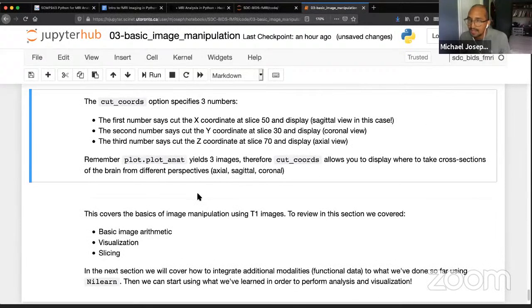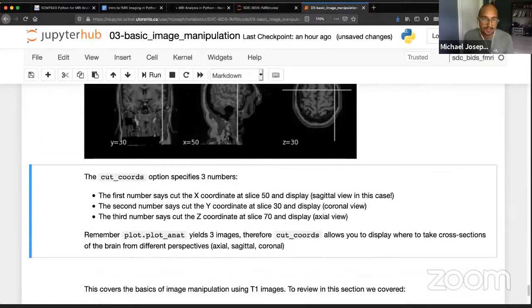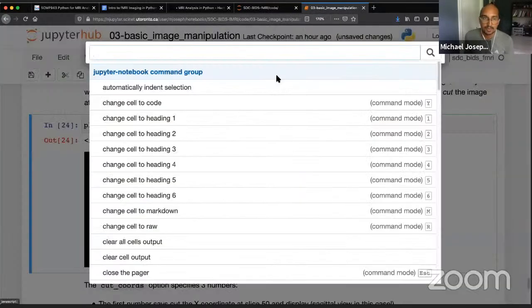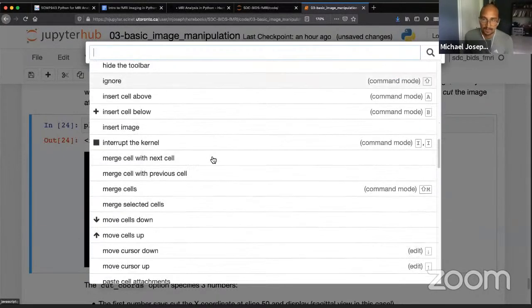And oh, James said, I'm not following the keyboard shortcut. So yeah, there's multiple ways to run things in the Jupyter Notebook. You can use, I think this toolbar here will give you probably most of the functionality that you need. So adding cells, deleting cells, copying cells. But also if you click on the keyboard icon, this will show you all the possibilities.